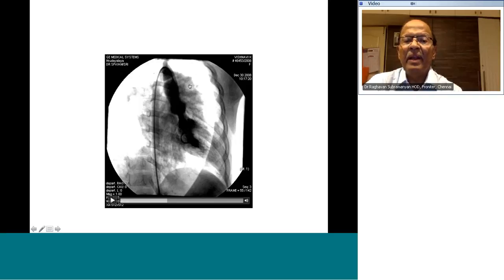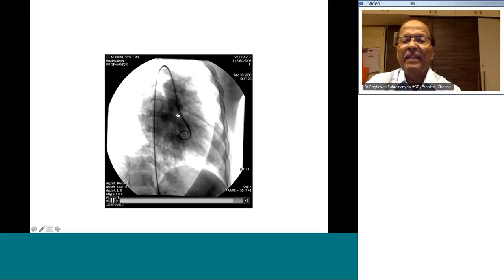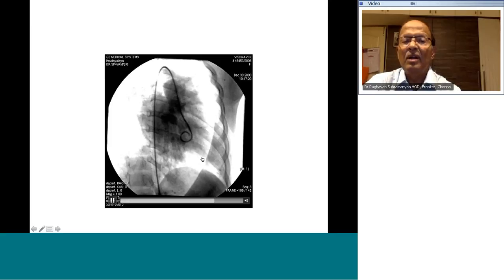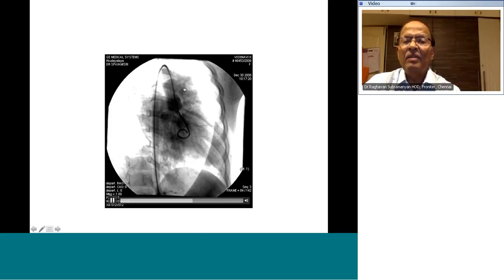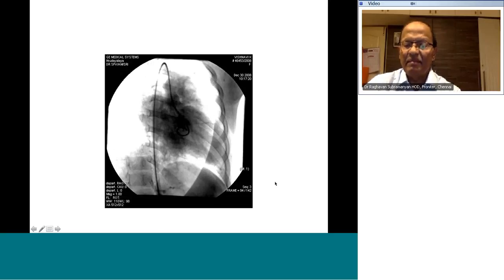It's only when the pulmonary artery fills and late in the cardiac angiogram that you get the atrial filling from recirculation from the pulmonary vein. Therefore, there is no mitral regurgitation and the atrium is filling only when the pulmonary artery fills and recirculation comes. Therefore, this is an example of a complete AV canal defect because there is pulmonary artery filling through the VSD, gooseneck deformity, but there is no significant AV valve incompetence. Right? Agree? So that's a gooseneck deformity.